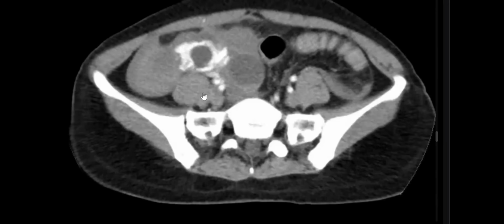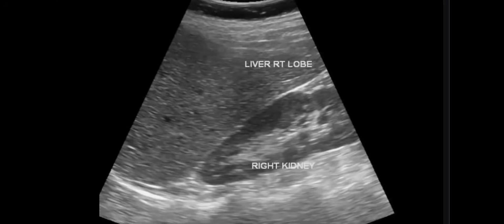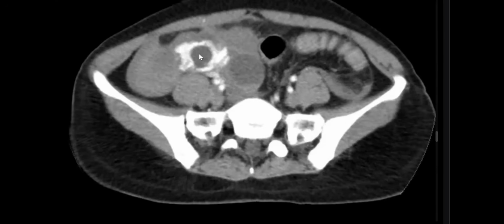Yes. This is equivalent to the sonographic sign named ring of fire. If interrupted, ultrasound, ectopic. Yes, it's a disturbed ectopic. It's a ruptured ectopic, and the ectopic is extra-ovarian. It's tubal. So you may see the ovary containing corpus luteum, containing cyst, whatever. And this is extra-ovarian in nature. So again, acute pelvic pain in a middle-aged female with adnexal hematoma, adnexal heterogeneity.